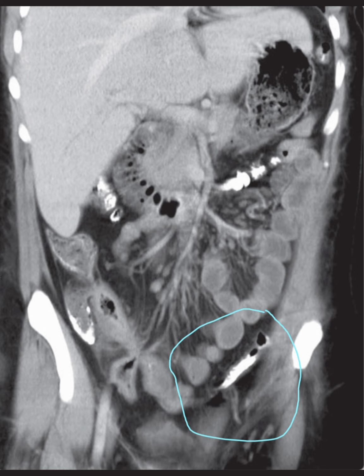So, in summary, these CT findings strongly suggest Crohn's disease with a potential enteroenteric fistula. I'll make sure to relay this information clearly to the treating team for further management.